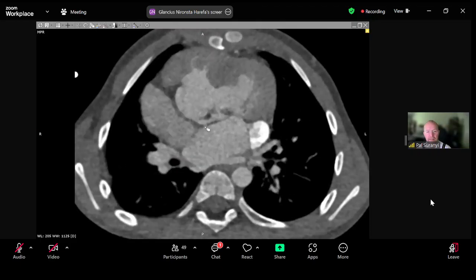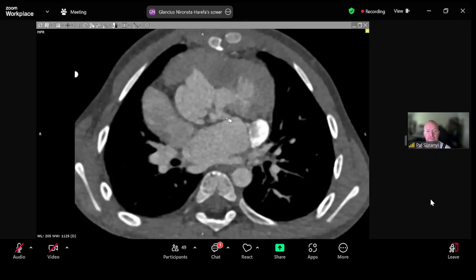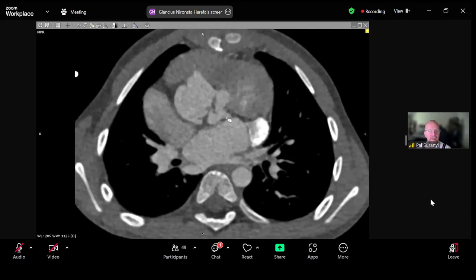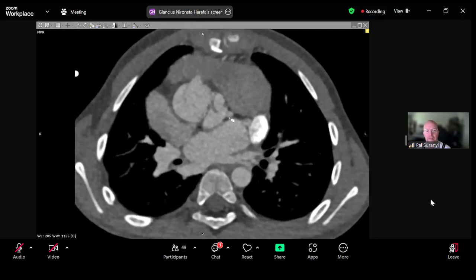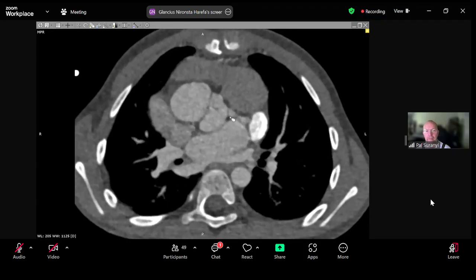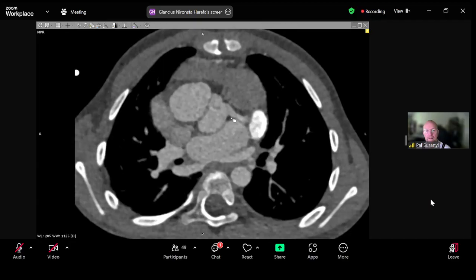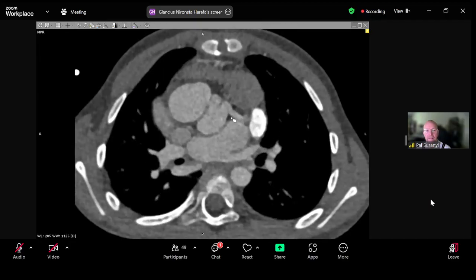Very good. So, yes, we see that single coronary coming around posteriorly, goes around even the pulmonic root. I think Dr. Amal had an excellent point when we discussed this case earlier about that. Yep, that's where it splits into that left circumflex and that rightward branch.